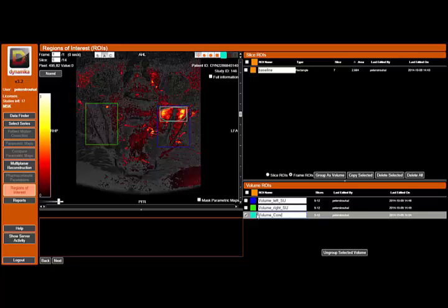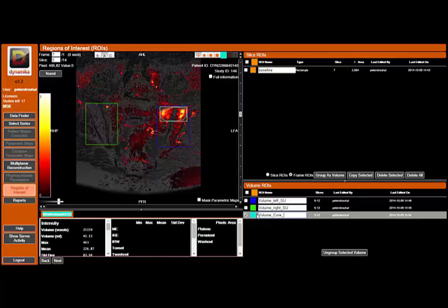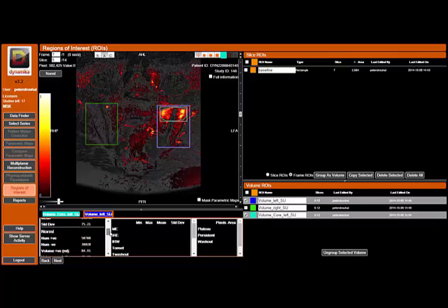What's perhaps less obvious is how you can highlight how much of the marrow signal is actually abnormal, where the right SI joint looks remarkably normal. The left one, actually on the color map, looks more abnormal, and this holds true when you specifically look at the pixel intensity values within that larger region of interest, as well as looking at the color map.